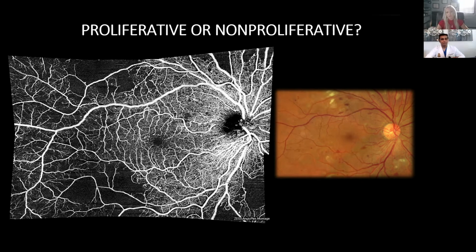So here on the OCT angiography montage, we can appreciate that there's definitely this non-perfusion in the periphery that we kind of expected based on a lot of the cotton wool spots and retinal infarction that we saw on the color fundus photograph. But look down in this area where there's a very large area of capillary non-perfusion, if we look over at the retina, there's nothing white, so this isn't any sort of acute infarction. This must have been some past infarction that had occurred in the retina. And OCT angiography is making that visible to us, while just looking at the fundus, we can't visualize that with fundoscopy alone. And we can start to see that there is, in fact, some irregular vascularization on the disc.